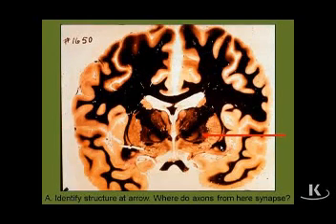Our next question is a coronal section myelin stain through obviously cortical structures, diencephalic as well as basal ganglia. And again, for reference, look for large, heavily stained structures such as the posterior limb of the internal capsule. We know it's the posterior limb because we have basal ganglia situated lateral to it, but what gives it away as being the posterior limb is we have thalamic nuclei medial to it, along with basically the body of the caudate nucleus.